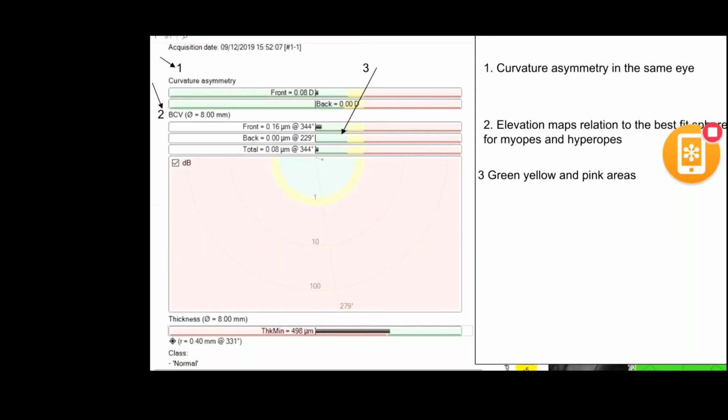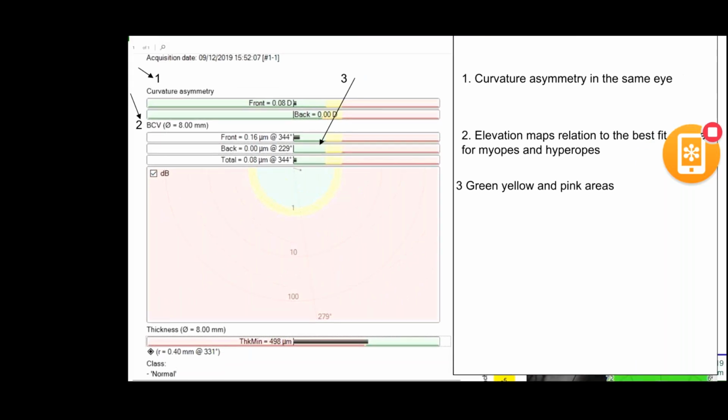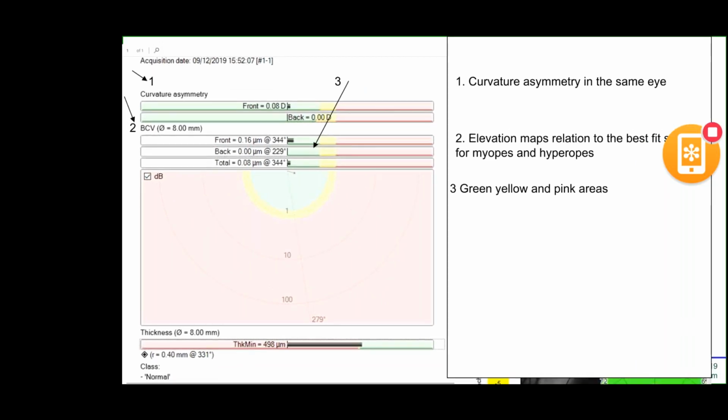So nowadays, since you're putting the OCT, the epithelium, the keratometrics, and the higher order aberrations together, you don't have to rack your brains too much. Ten years ago, we had to use three scanners, and you had to really rack your brain over whether it's a normal scan or not. Nowadays it's so easy, the software will just tell you it's a normal scan and these are the values, okay? But this is artificial intelligence. There are certain times the artificial intelligence is not adequate.